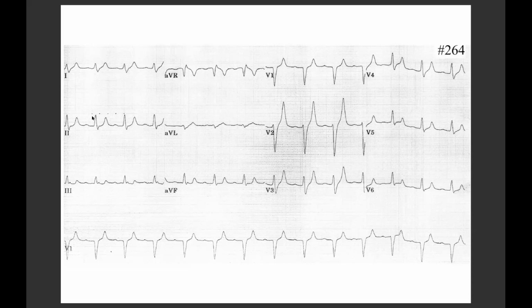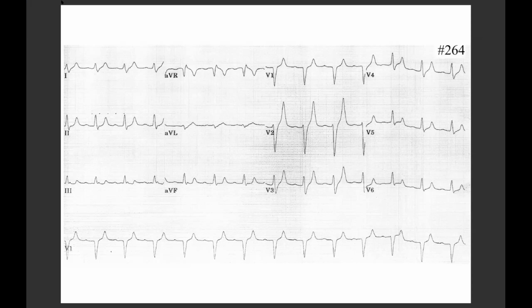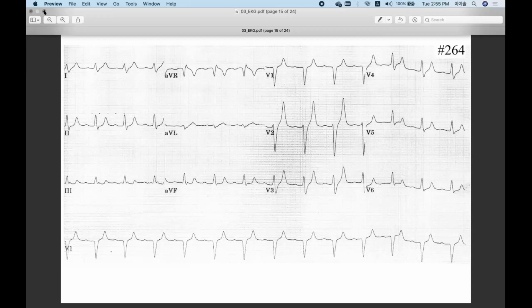That could indicate some kind of ion disturbance. Hypokalemia. Nope. Hyperkalemia. Yes. Okay, very good. That's hyperkalemia. This is how hyperkalemia looks like, especially when you do have a severe one.